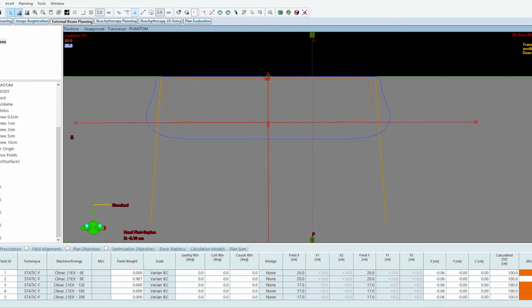So from here, I'm roughly 8 millimeters is how thick my penumbra is at the 80% isodose line. At this depth, this is my penumbra. So now my penumbra is 1.7 centimeters. It's huge. So my penumbra increases as my depth increases, and that's because the electrons lose energy as they travel through the tissues, and that also increases side scatter.